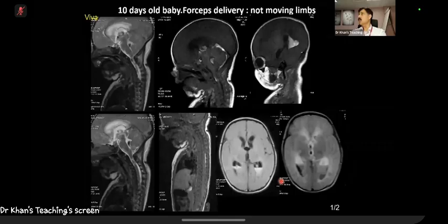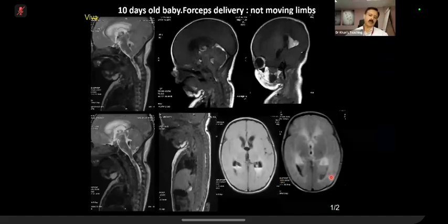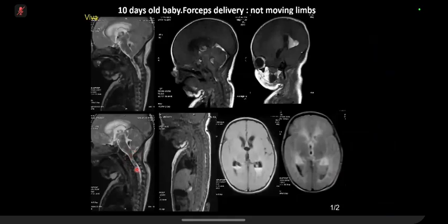What's happening in the cord? There is low signal on T1, high on T2, at the kind of atlanto... yes. So how will you call it? What word will you use? Contusion. Contusion. That's fine. Yeah.